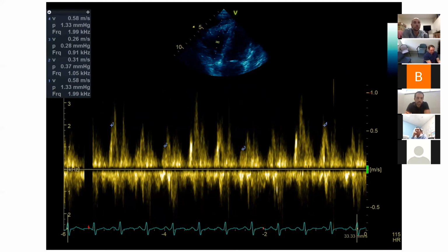And this is an inflow through the tricuspid valve, pulse wave. You'll have to trust me that the measurements are actually E wave. Okay. And there's no, what do you call it? Which one's inspiration, which one's expiration? No, we haven't got a trace, unfortunately. We've just got lots of cycles.